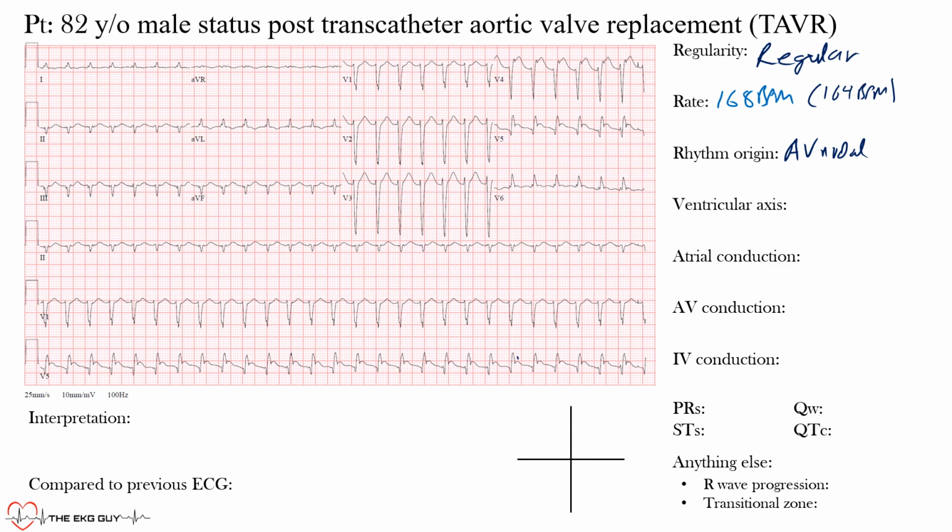All right, so the axis, we're going to use the ventricular axis, and so that way we will use the QRS complexes. Remember that normal axis lies between negative 30 degrees and about positive 110 degrees, meaning that all this area here is considered normal axis in adult. This is considered the left axis deviation range, okay, and this would be right axis deviation. And this is what we call no man's land, or a superior rightward axis, or a northwest axis.